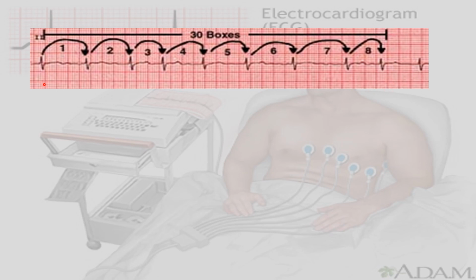How can we get 6 seconds from the ECG? As we said, each small square is 0.04, each big square is 0.2. So 5 big squares are 1 second. So I need to get 30 big squares. So I will check in the ECG from the beginning, put a mark like this and try to count 30 big squares. In these 30 big squares, you can calculate how many spaces in between, or calculate how many QRS complexes. It is nearly the same. Then multiply by 10.